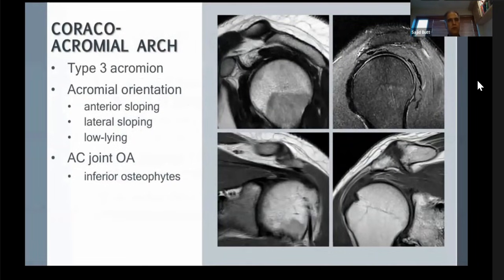One of the anatomical variants can actually predispose to early rotator cuff tear, and that is type 3 acromion. If you look at the sagittal imaging, as this is a sagittal projection, that's the coracoid process, that's the acromion. We can see that the undersurface of acromion normally is concave. But in this patient, that concavity anteriorly has resulted in a little hook-like projection.